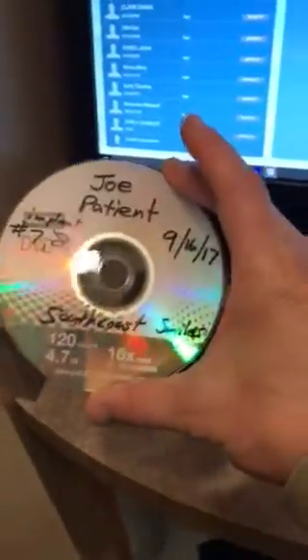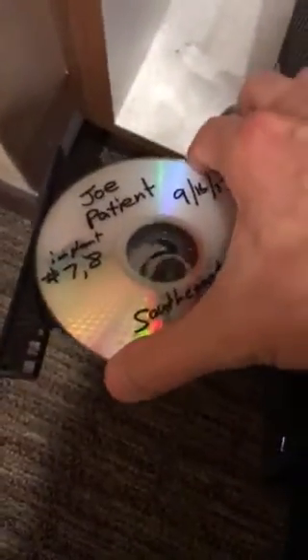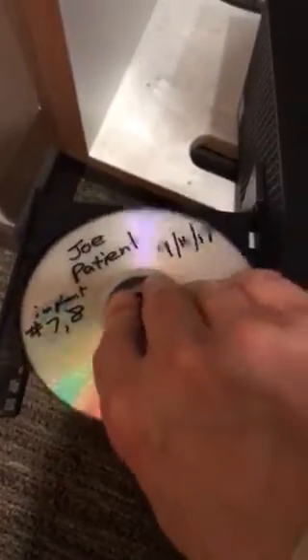So I have a disc that I took from the back. I put the patient's name on it, what I want done, the date, and which office it came from. The label is on the outside. Pretend the computer is laying flat on the table. So the writing is up. It goes in. You got to get the disc the right way in the computer.